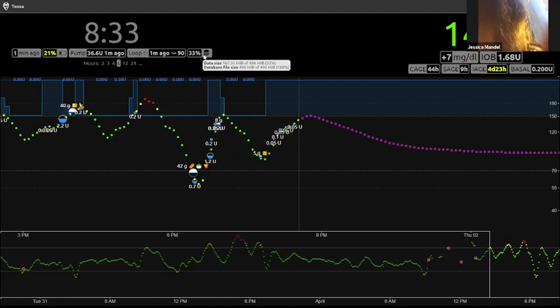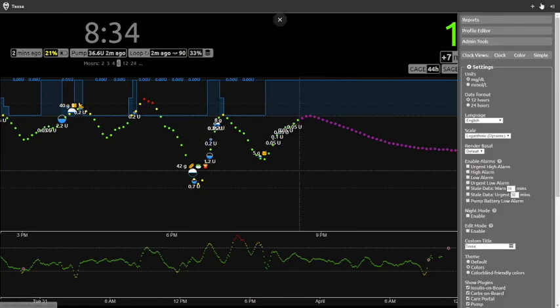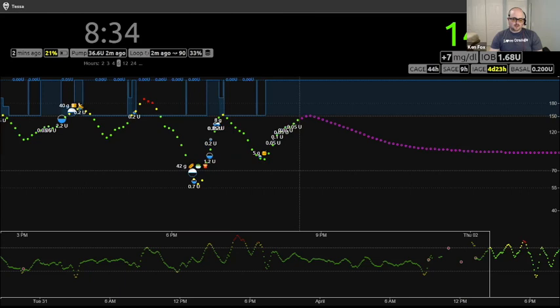But this can be a nice way to see when you're coming up on that space constraint, because Nightscout starts getting weird and doesn't always log all the data, and sometimes causes red loops because the loop can't push the data to Nightscout and it's not received in an orderly manner. Then loop kind of locks up a little bit. So this is new in the new version here. So there we go. Okay, so let's go into the Nightscout menu.